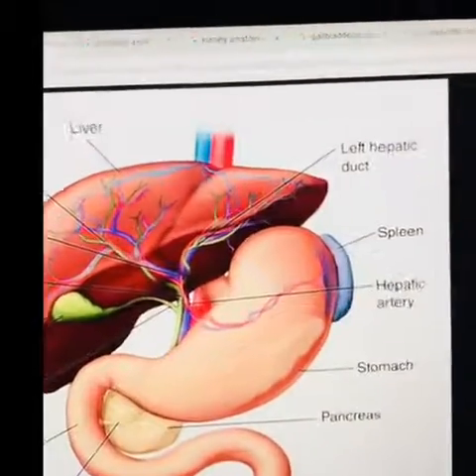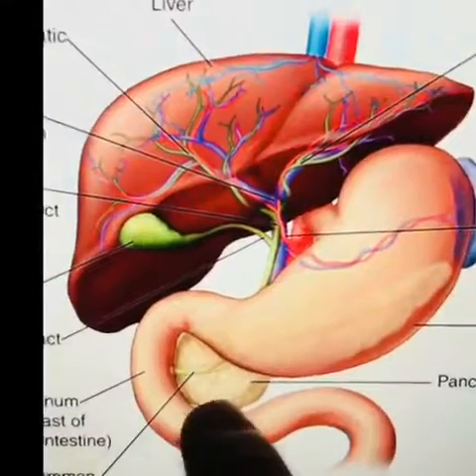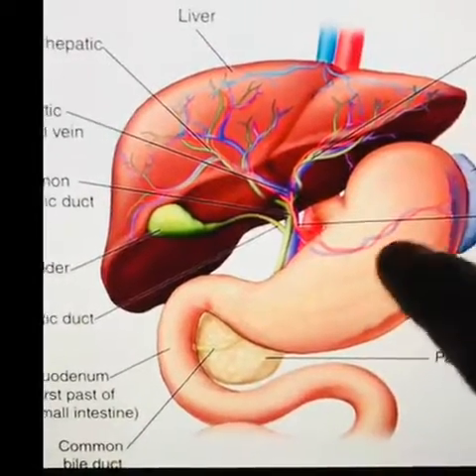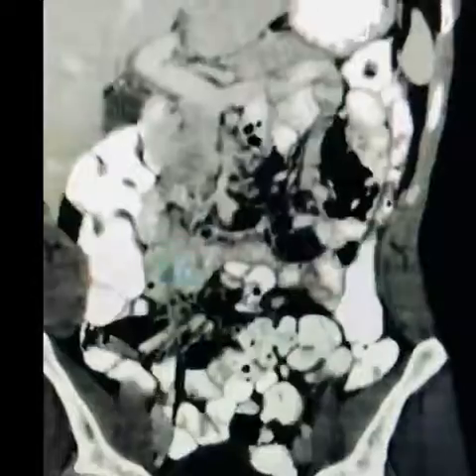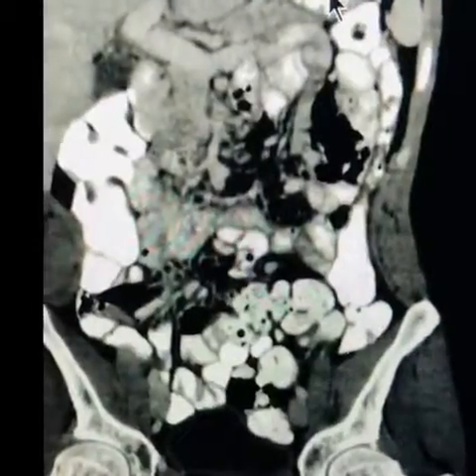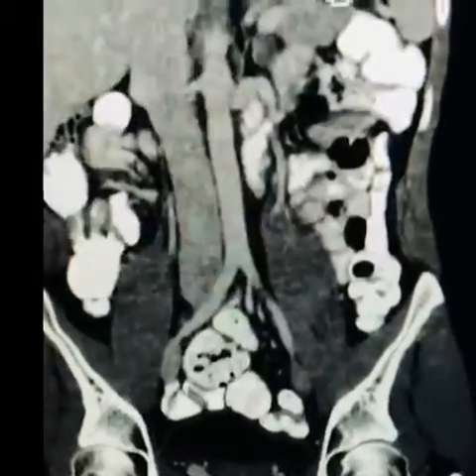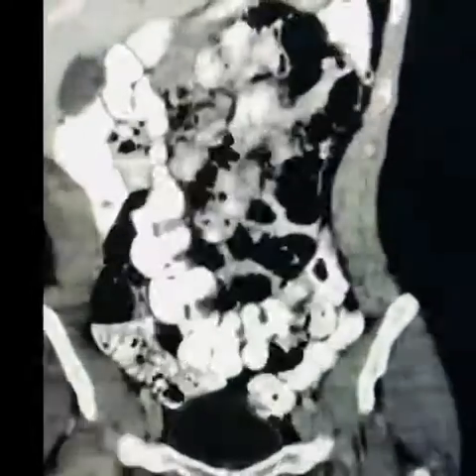This is the spleen hidden behind the stomach. And here's the stomach. And we're going to also look at the pancreas, which is this yellow thing behind here. So let's look at those. And we are about to be done with this section. But this is the stomach. This is white because it's filled with barium, the stuff that you have to drink before you get a CAT scan sometimes. And that is really dense, so it is white as well.